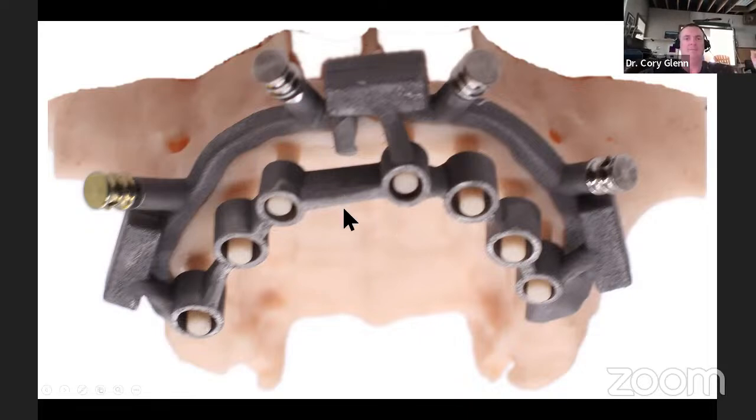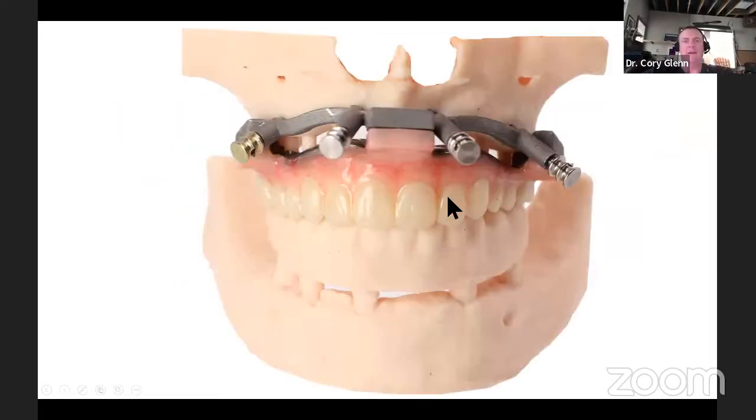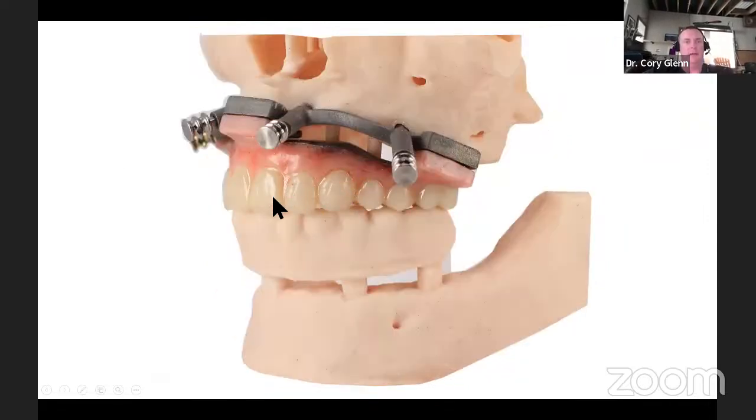So here's the drill guide. Hopefully your implants end up right where those printed pegs are. That's it from a frontal view. And then here is the restoration as it's going to go on there. All right. And again, is it the same aesthetics as a really nice zirconia hybrid? Obviously it's not. This was a 5-minute pink job, but even in this form with minimal effort expended to do the pink, if you've got a patient that just wants to get back into having teeth, especially if they're coming from no teeth to start with, tell me they're going to refuse this.